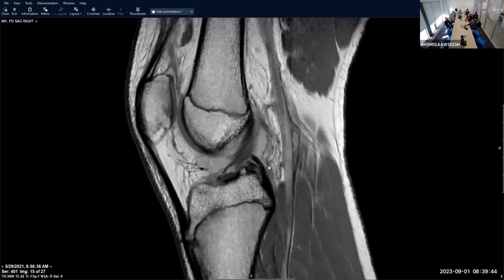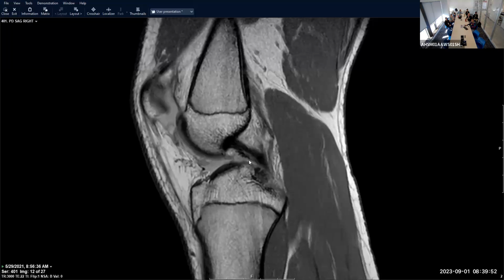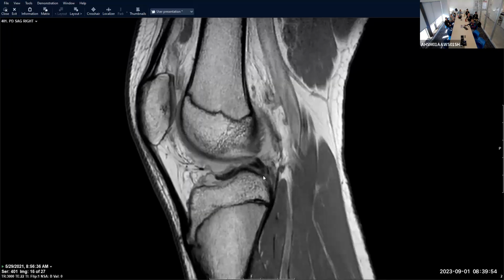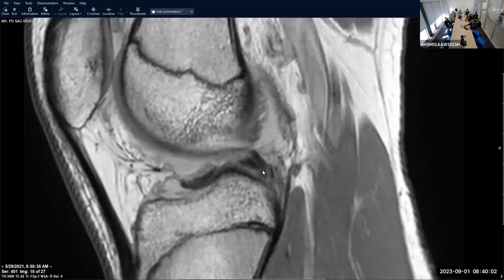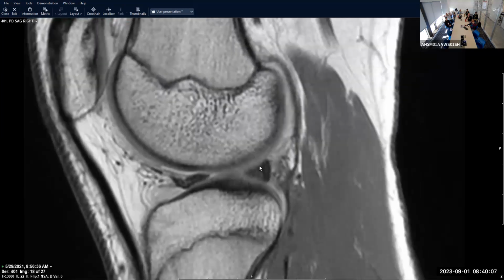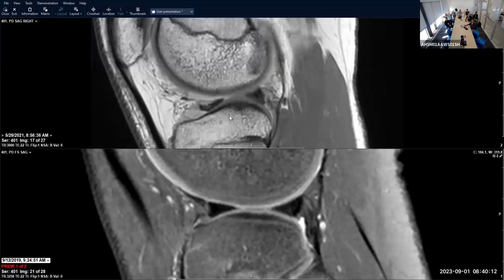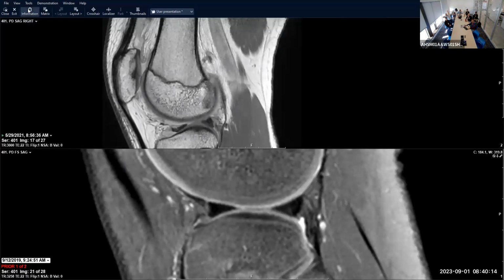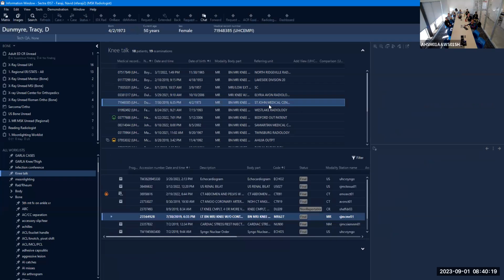While we're here, here's that meniscofemoral ligament of Risberg posterior to our PCL. There's one sometimes anterior to the PCL. You can see it here, known as the meniscofemoral ligament of Humphrey. Just normal structures. They're important to know because you don't want to mistake signal between one of those ligaments and where it's about to attach as a tear, because you're allowed to have signal there until you get further out, beyond 14 millimeters. It's probably less in pediatric cases, I guess, because the knees are tinier, depending on the age.